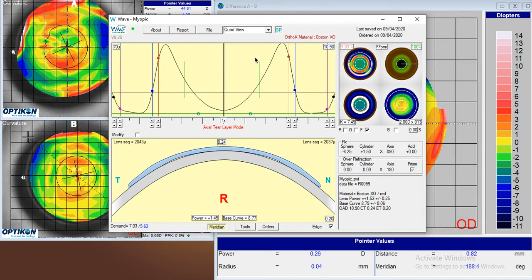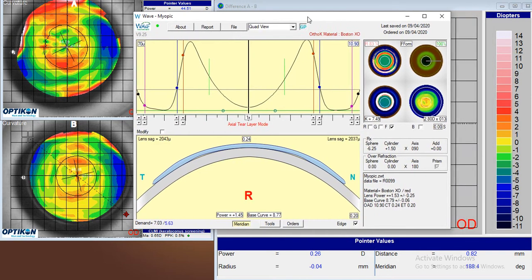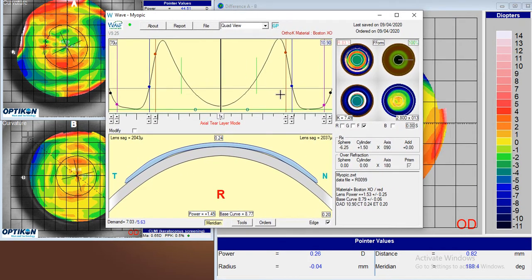The submitted data indicated that with the lens on, the patient was refracting at minus 0.75. And so that tells us our initial base curve is a little bit too steep. Could be from these steep areas on the baseline topography. Software looks at data in here to estimate a simulated K and possibly just overestimated based on how the topography looks. So I'm going to immediately flatten the base curve by 3/4 of a diopter, and we'll do that by clicking up at the red control point here.